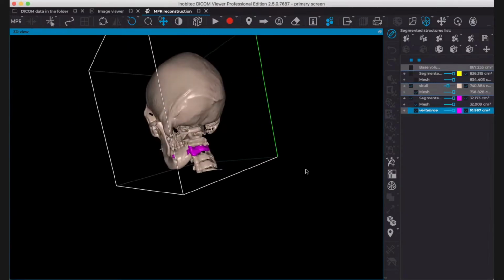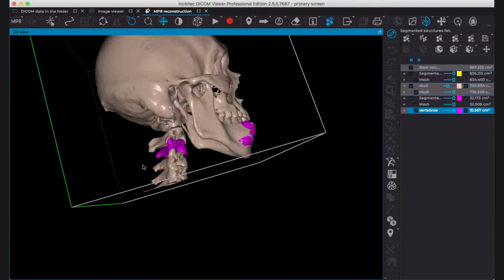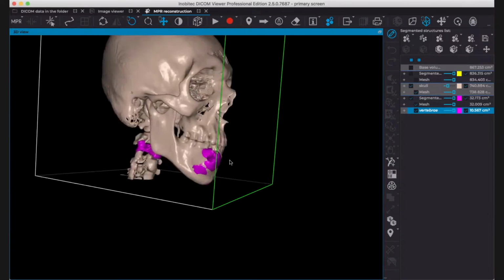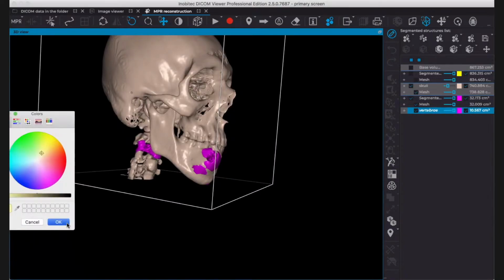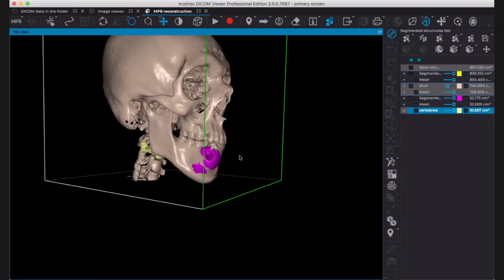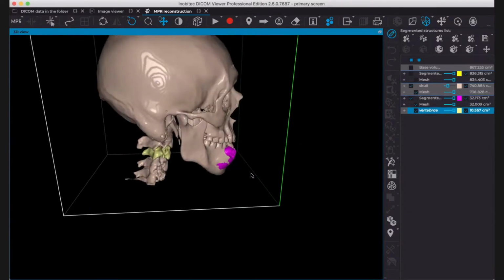And this is very nice because it's very useful when you work, for example, creating surgical guides for this patient. You can work in whatever software you use for your virtual surgical planning. And then the last step, I would recommend, is double checking that whatever you planned, let's change this color, whatever you planned goes exactly with the model you first created, so that you know it's precise.